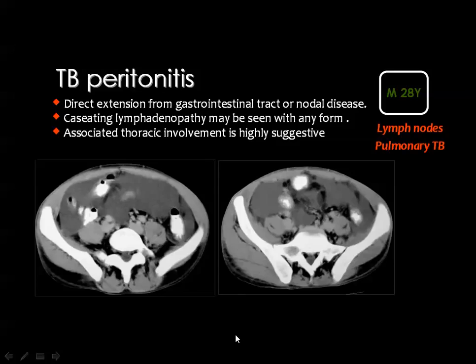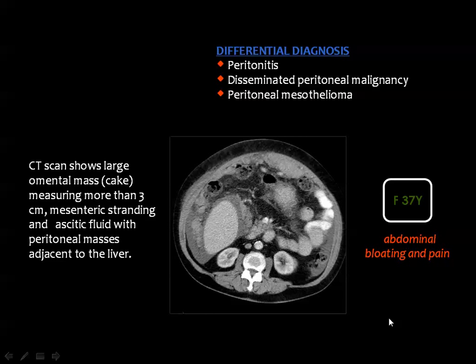And you may have some aspirate and the culture and do culture and sensitivity to confirm the diagnosis. Then if you see peritoneal masses like this soft tissue mass in the region of the greater omentum, and you can see also masses here, and this is ascites, then you think mainly in most of the cases that this may represent metastatic disease, and the diagnosis is usually confirmed if the patient is known to have a primary malignancy.